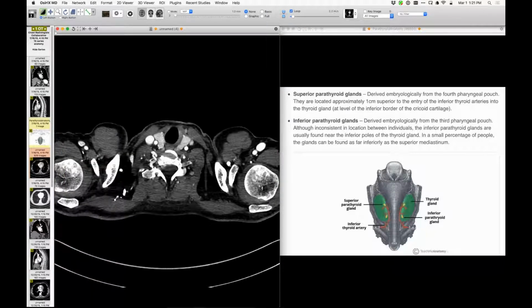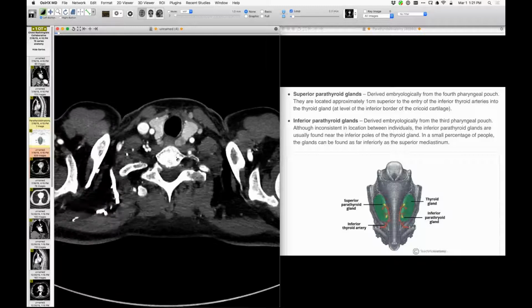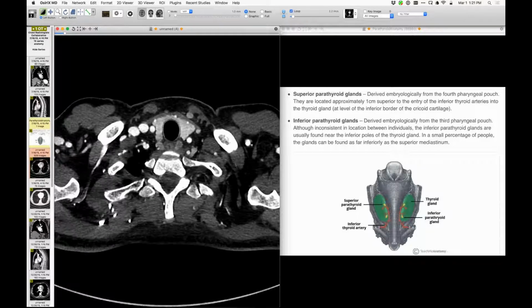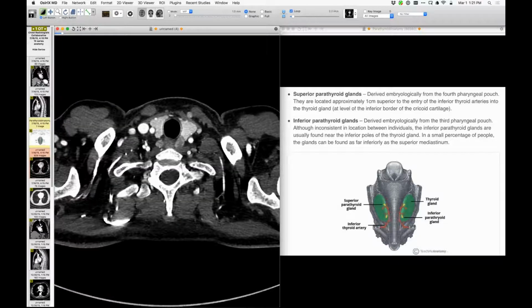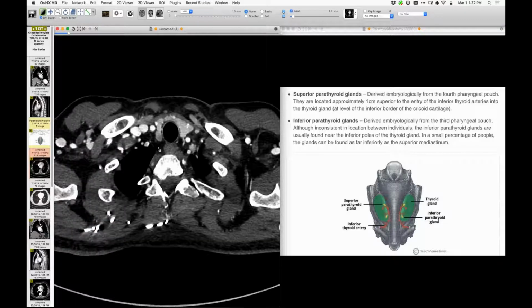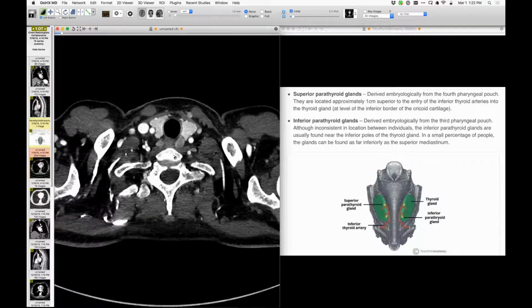And take a look at this person's parathyroid. So here we go towards the lower poles of the thyroid, and you'll see we have 1, 2, 3, and 4. 1, 2, 3, 4 parathyroids. And it's interesting that they project sort of inferior to the thyroid lobes, whereas usually the superior ones are a little bit higher than the inferior ones. So I am pretty certain that we are seeing these parathyroids. And it's kind of interesting where they are. And we can see all 4 of them.